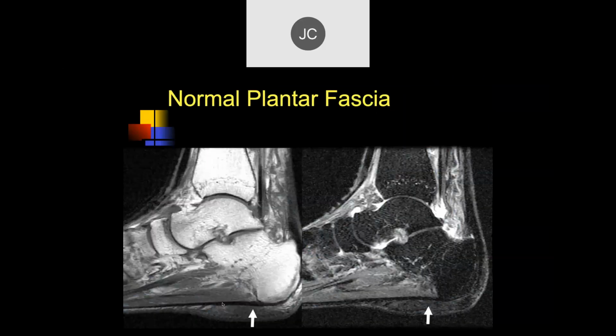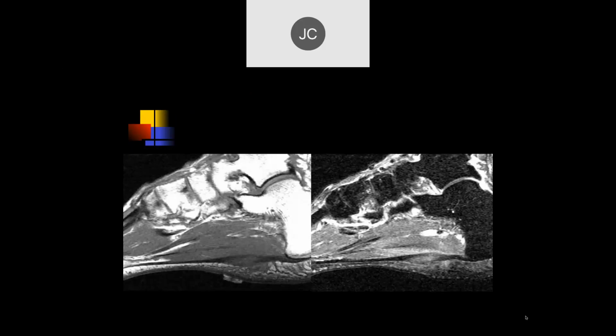So here's what the plantar fascia looks like on an MR examination, as you're all familiar with. Here's a nice normal attachment, nice and black. The type 1 collagen fibers predominate here, and they should be nice and black, and the bone should not have any edema within it. So when you get what's commonly called plantar fasciitis, which I strongly recommend that people not use, even though that's the common term for it, these are actually not inflammatory lesions, even though they have pain.